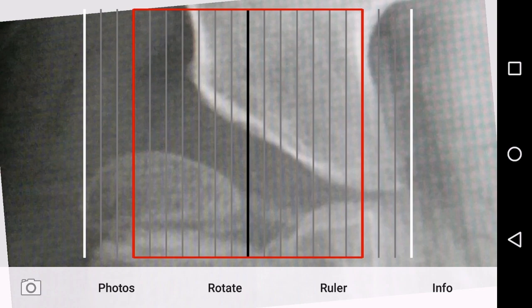Now, notice the edge of the acetabulum is inside the red box. If the lateral edge of the acetabulum is within the red box, the migration percentage must be 30% or greater, and a referral to a pediatric orthopedic surgery specialty center for continued hip surveillance management is indicated.